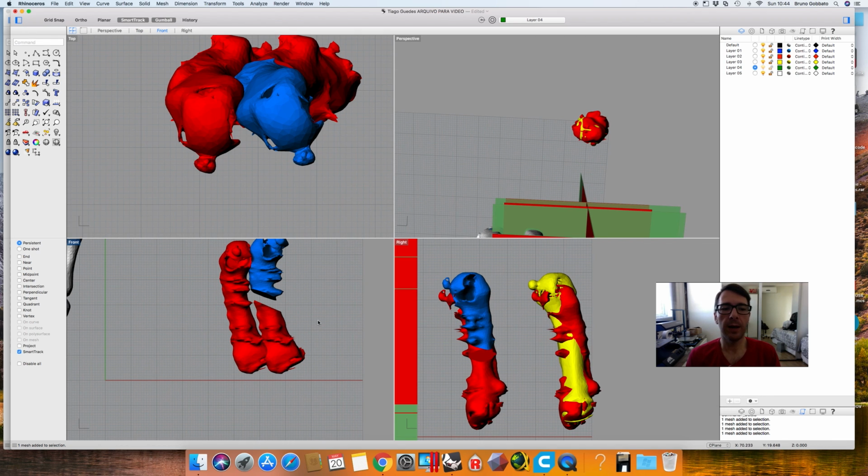Now we are going to create some measurement devices, 3D printed measurement devices, to help the surgeon perform the surgery. I'm not going to perform it. To help the surgeon have the correct ways to check for the length of the metacarpal bone, but principally for the rotation. We are going to use the pre-drilled holes from the plate in order to help the surgeon check for the rotation and even for the distraction of this patient. So we are going to create a ruler, actually like a ruler, that is going to use the pre-drilled holes from the plate in order to check the correct position of length and rotation.